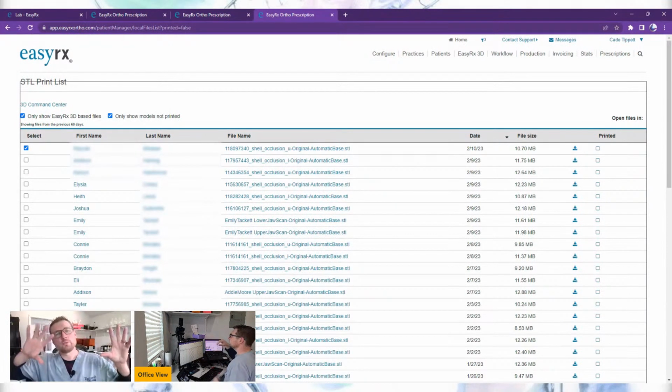So we're at the point where the wife has checked in a case, the front desk guy or girl checked in a case. They put them in your 3D print queue, and now I'm ready to print. So I like to print 6 at a time. We can discuss this later, but the 3D printers I use, I like to print them flat on their base, and I can fit about 6 in there. So I usually grab a stack of 6 on here.